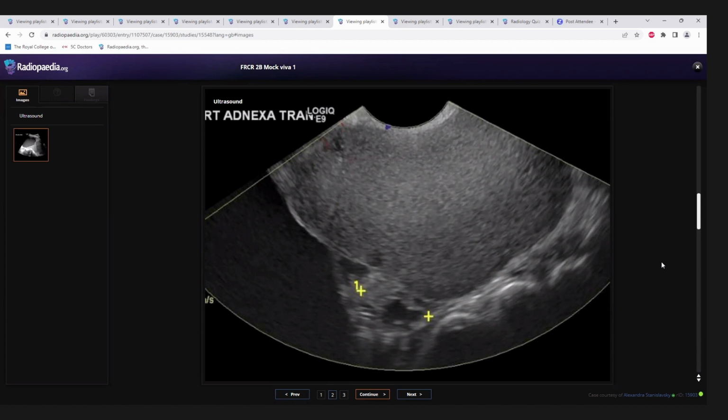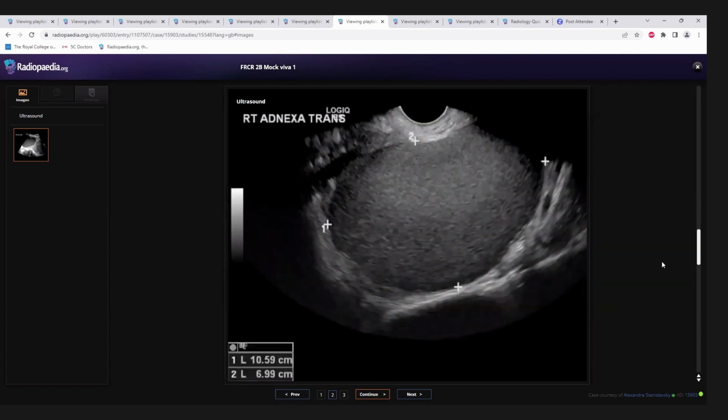So the cystic lesion, which is showing coarse echogenic contents and a fluid level, is most likely to be a mature teratoma. I would like to proceed with the MRI just to see if there are any contents of immaturity, any enhancing solid components, anything that is suspicious of a malignancy. And in the ultrasound also, I would look for any ascites, which could be another sign to suggest malignancy. But this looks mature to me because of the thick, pultaceous looking content.